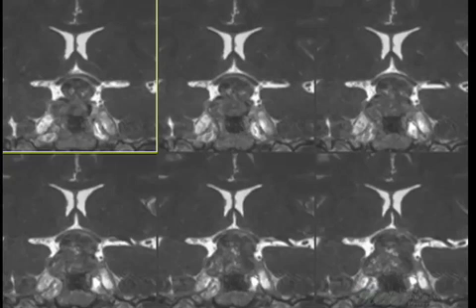This is the sequence in which you can see the optic chiasm very well. So you see the mass, and the mass and optic chiasm are separately seen. You can see the degree of deformity and compression of the optic chiasm very well with this specific sequence. This is a CISS sequence, which is a very thin, 0.8 millimeter thick sequence. Because it is so thin, you can delineate small structures like the optic chiasm separately from the tumor. It is also very sensitive for CSF signal, so everywhere the CSF is well delineated. You can even see some CSF signal between the tumor and the optic chiasm.